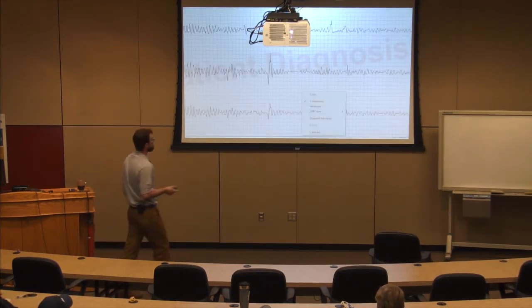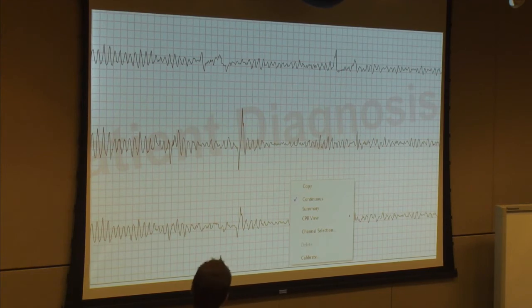So here's an example of torsades, right? I have polymorphic VTAC, right? Polymorphic VTAC. This was Ty Bruner brought this one in. Polymorphic VTAC.